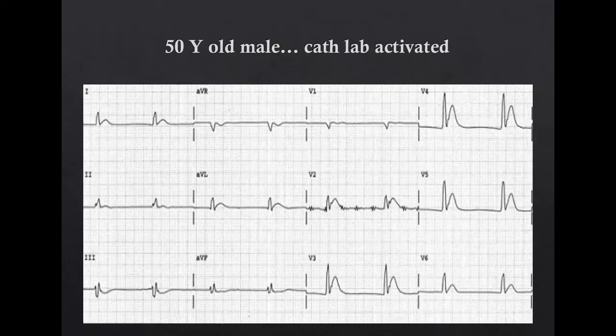Okay, so basically, what I'm showing you here is an ECG feature of severe hypercalcemia. And what hypercalcemia does, it pulls the ST segment in. Can you see that? And how it creates a shortened QT interval. So basically, if you have to remember, hypercalcemia pulls it in, right? And hypocalcemia takes your ST segment and flattens it out. So hyper pulls in and hypo pulls out. All right, thank you.